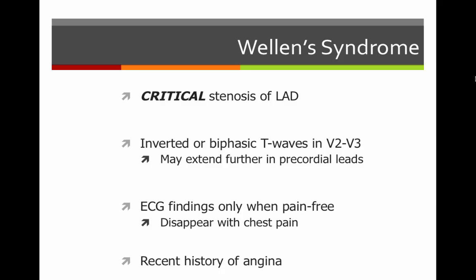Let's move from ventricular tachycardias to a couple indications on 12-lead that you should be activating the cath lab immediately. First is Wellens syndrome. If you see this, this is a critical and emergent stenosis of the left anterior descending coronary artery. If you see this, you should activate the cath lab immediately. What you're going to see is either inverted or biphasic T waves in V2, V3. They may extend a little bit further in precordial leads, but typically V2, V3.